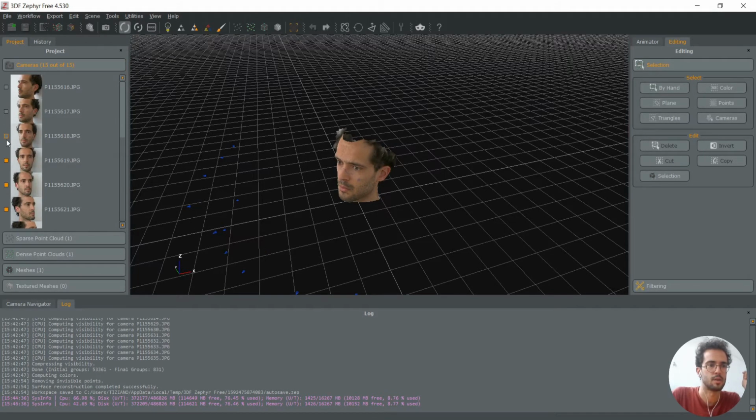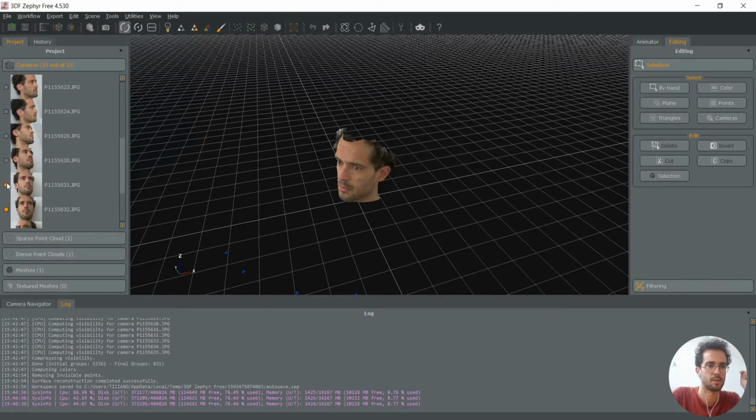I just deselect this so I can have a clearer view without the cameras on my screen. Okay, done.